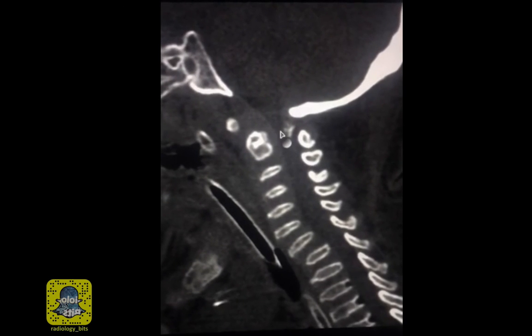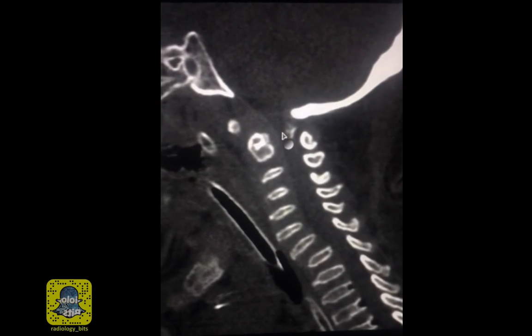And of course, there are other skeletal and non-osseous manifestations that we don't see here. Before I leave, I'll just emphasize one thing. This beaking of a flat vertebral body is an exam favorite. So when you see beaking, think about mucopolysaccharidosis.